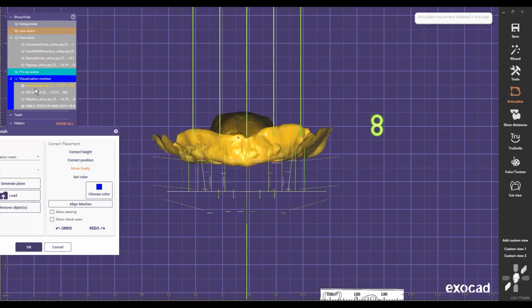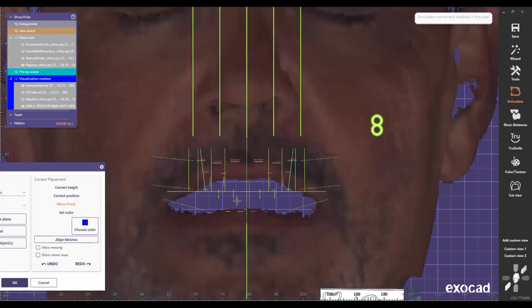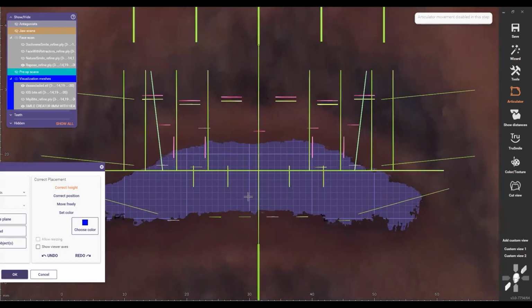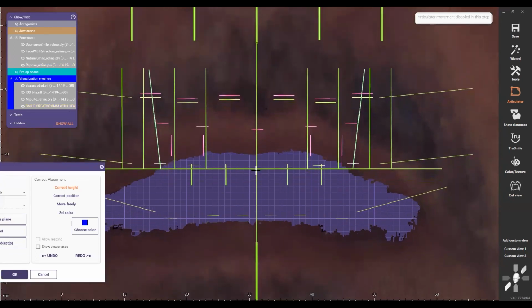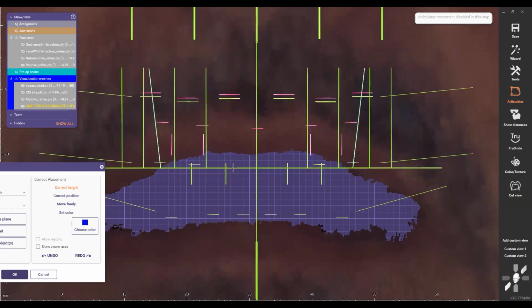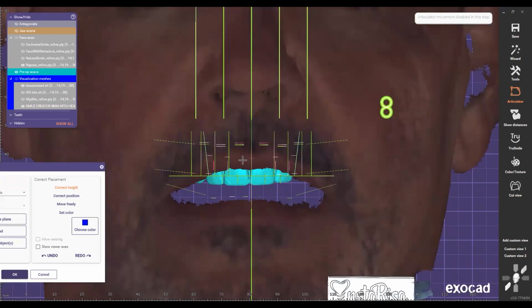So the only thing I need to do here is find a new incisal edge position for my patient, right? And the only way I can find it is by using repose. Aesthetically, the study says that if we show at least 2 millimeters of incisal, we're going to get nice aesthetics, a beautiful smile, because the patient is going to show enough teeth in repose and also in the natural smile. So I'm going to measure 2 millimeters from this part right here, and each square in the background is 1 millimeter. That tells me my new incisor position is going to be just right there. So that means I will have to make this incisor a little shorter, based on this.